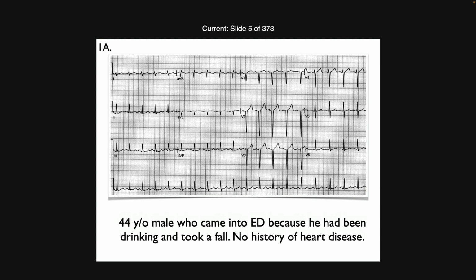I was thinking pathologic Qs in V1, 2, and 3. Excellent, okay. I think old STEMI, but he says no history. Okay, so everybody see that? The pathologic Qs in V1, V2, and V3. And Grace, pathologic Qs in V1, V2, V3, what do those suggest?